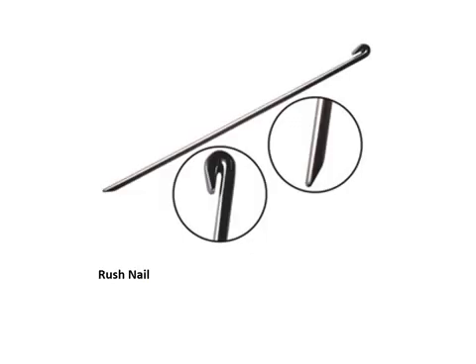Then we have a Rush nail which is bent at one edge, which is used for fixation of the long bones, mainly in children, and the bent edge is there so that it stays along the cortex of the bone to prevent its migration into the intramedullary cavity.